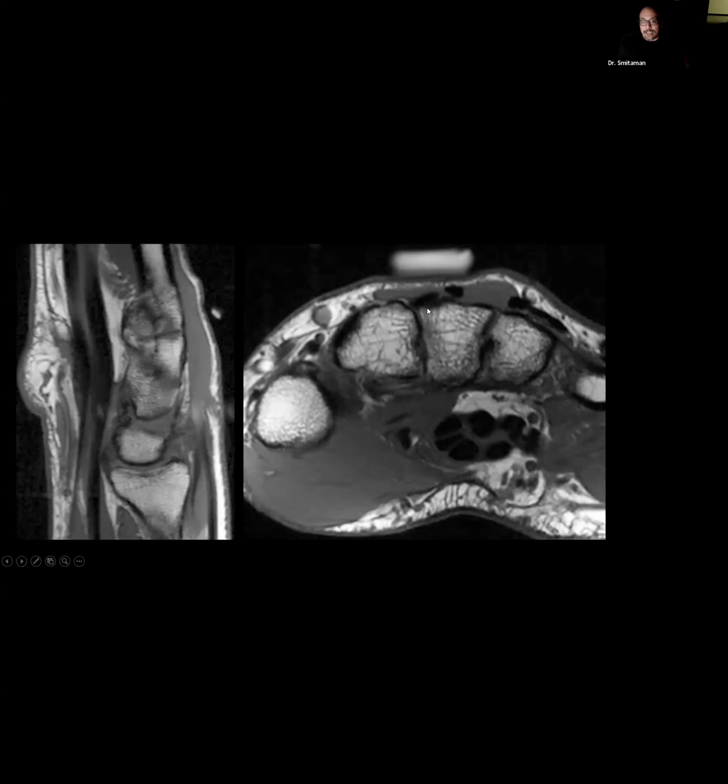As in this case here of the wrist slash hand, we see this fiduciary marker marking, okay, the extensor digitorum brevis manus muscle. And if you feel the back of your hand right now, typically you should only feel tendons. You shouldn't feel a soft tissue mass or anything like that. There should be no muscles crossing your metacarpals. So if you have something there with muscle signal, this is one of the common anomalous muscles that can happen at the dorsum of the hand, and something to think about.